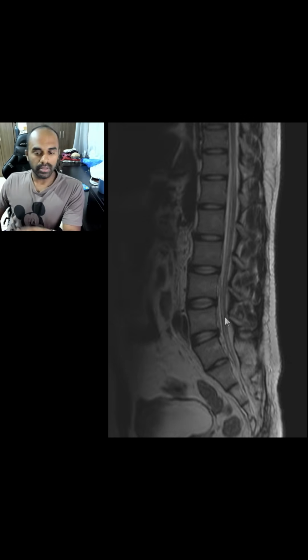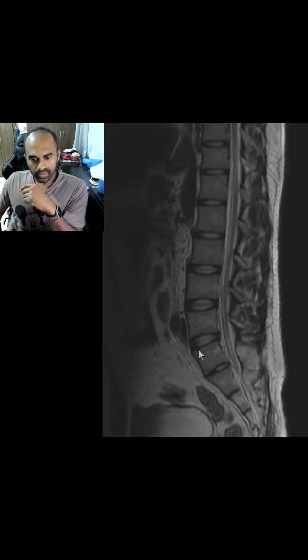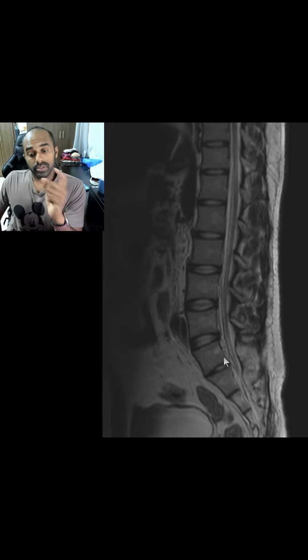significant discs. The discs all look very well hydrated, but you should always be careful whenever you see a vertebra which is looking almost of similar dimensions as the lumbar vertebrae, that is tilted and pointing towards the sacral elements. You should wonder, is there an element of transition?